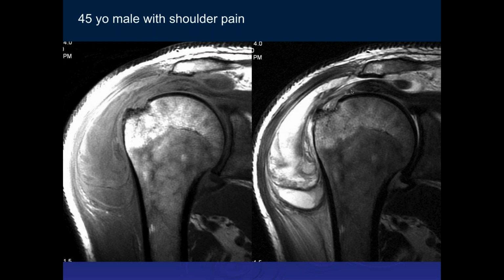So it's retracted here. Both the distal end of the tendon is retracted, and if you look at the muscular tendinous junction, it's also retracted by about the same amount. The only way you can get the whole tendon and the muscular tendinous junction to retract is if you have a full thickness tear. So you can say confidently that this is a full thickness tear, knowing that very rarely you can get scar in situ that we talked about last time, where you have a membrane here, which may make it a little bit difficult to see arthroscopically, but that's very rare, but just be aware that that can happen.